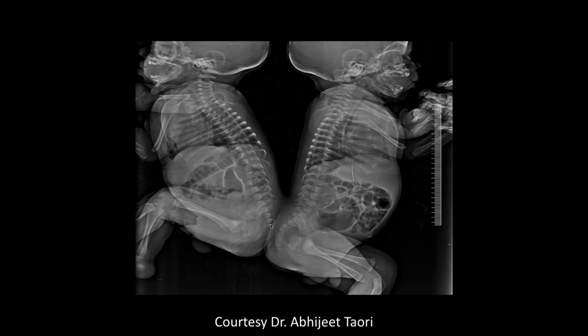It's definitely not normal. So what do you look for when you see something like this? As I recall, they were separated. I guess I would look to see if the central spinal contents are separate. Here it looks like the bone is separate, so I would imagine that the nerves are also going to be separate. Yeah, so what you want to do is separate them. What's important is for the critical element to be separated. It's going to need some good grafting.